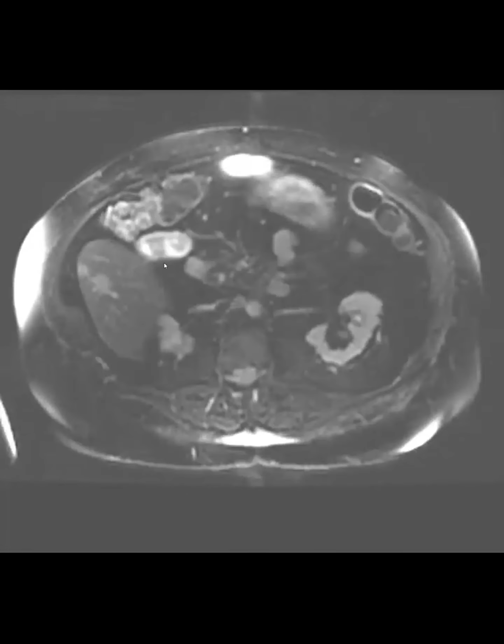Axial T2. While you're pulling that up, I do have a couple of questions. One is, in retrospect, is there anything hot there on the PET? No. So, oh wow. Here's the T2, right? And you can see that there's no way to call this on T2 on the axial.